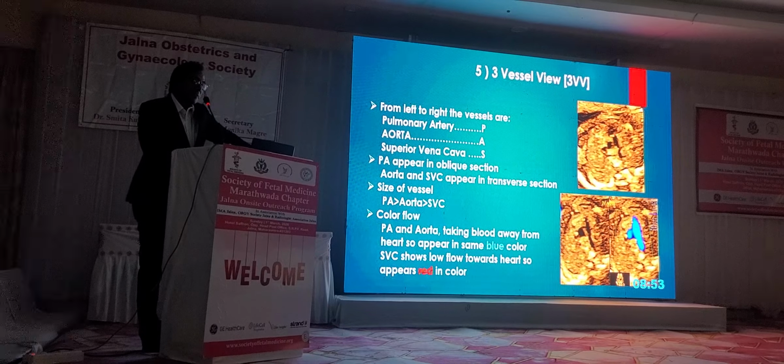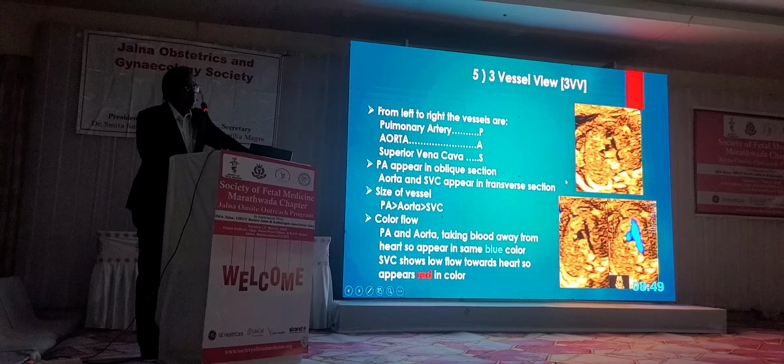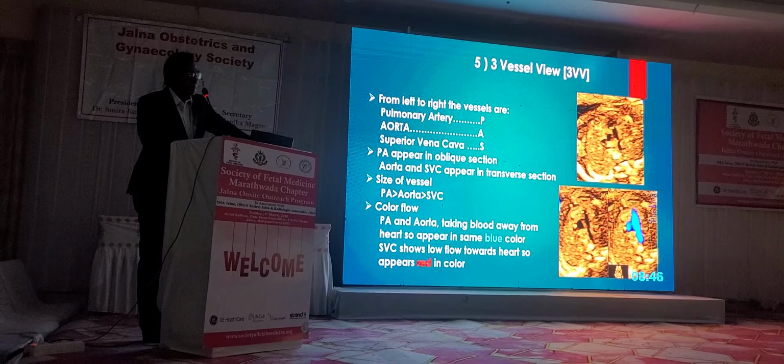Color should be in the same direction for the pulmonary artery and aorta because both are going away from the heart, whereas the SVC will show the opposite direction because it is going towards the heart.